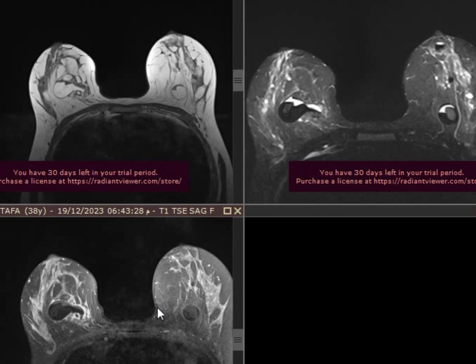What else? Oil cyst. What other oils? Galactocele. Possible. She has no history of breastfeeding, by the way, so this is unlikely. Lipoma with infection? If it's infected, it will show post-contrast enhancement, right? Which we agree there is no significant post-contrast enhancement. So, what about oil cysts? Is it possible? Yes.